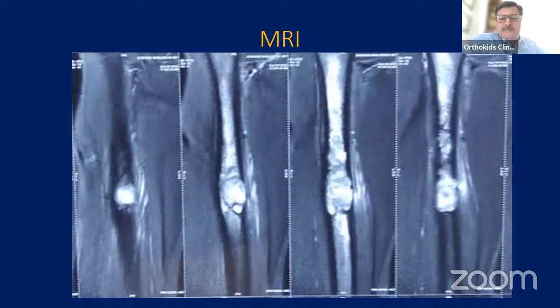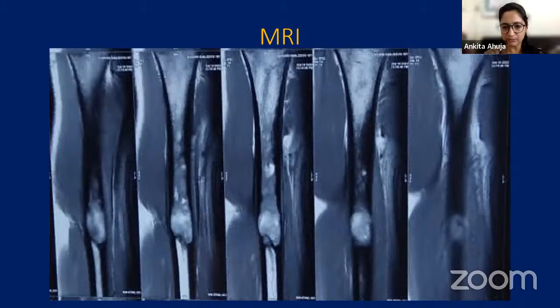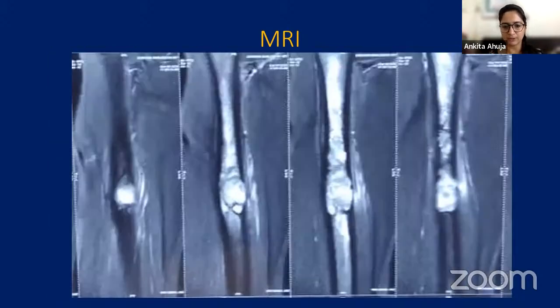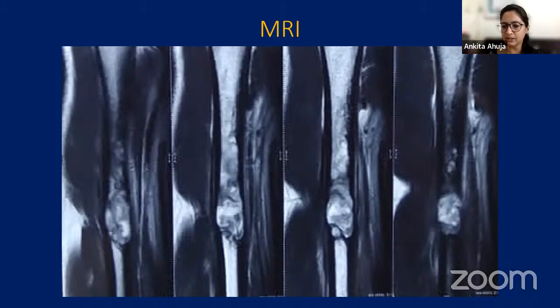Yeah, edema could be because of a pathological fracture, because the appearance itself is more like a fibrous lesion. Do you have another image, Joyance? What I was wondering is whether we see some fluid levels on that T2, but it was not very clear on the first image. Unless we have axials. We need to see the axials. Otherwise, one possibility is a fluid ABC transformation in an FD, which had fractured.